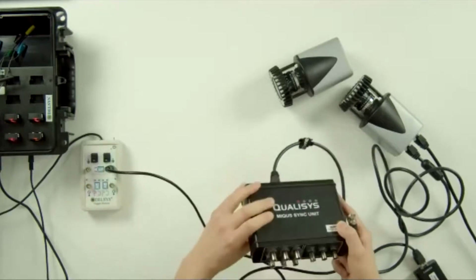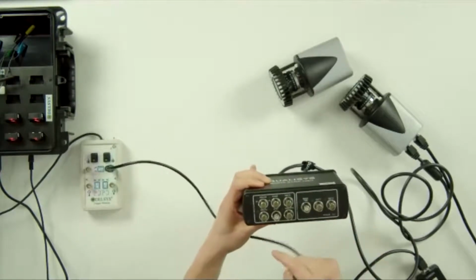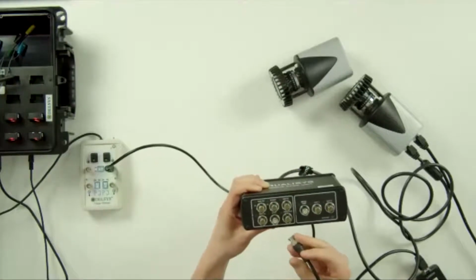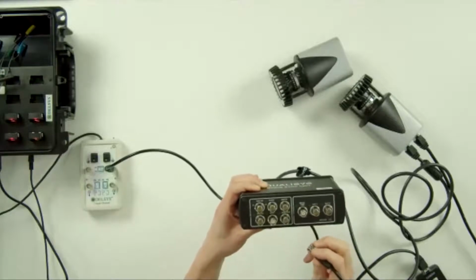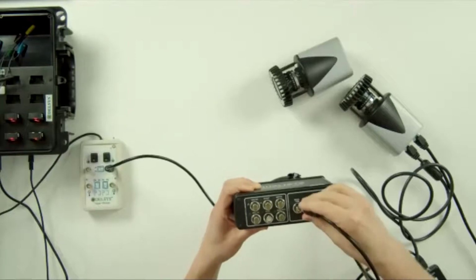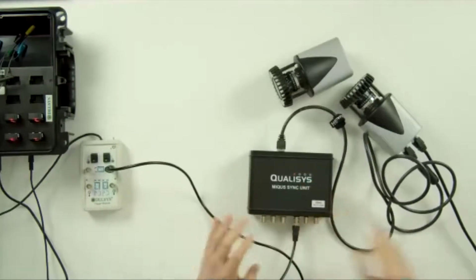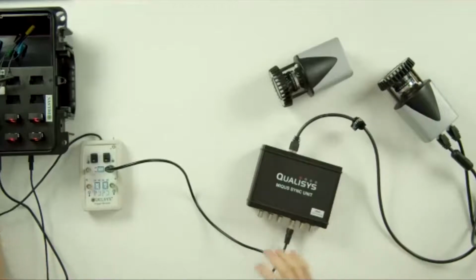With the camera sync unit, we have two different options to have the synchronization with the Qualisys. We can either use the trig NO, normally open. In this case, we would have a Qualisys trigger button connected as well to provide the trigger to start both systems. Alternatively, today's demonstration, we're going to demonstrate the measurement time function. This is our synchronization pulse. So at this point, we should be ready to go, apart from my poor cable management now, live.